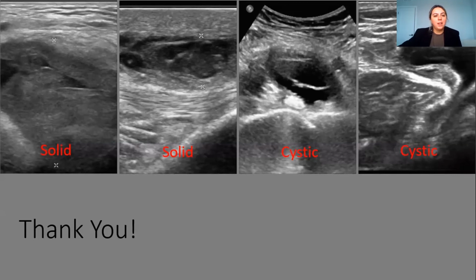Okay, thank you. Next question is, how can you differentiate bursitis from synovitis via sonography? So it's an interesting question that requires a little bit of clarification. As you can see on the images behind you, bursitis is an all-encompassing term that includes bursal distension with simple fluid, all the way to much more complex bursal inflammation with synovitis. So it's a spectrum.